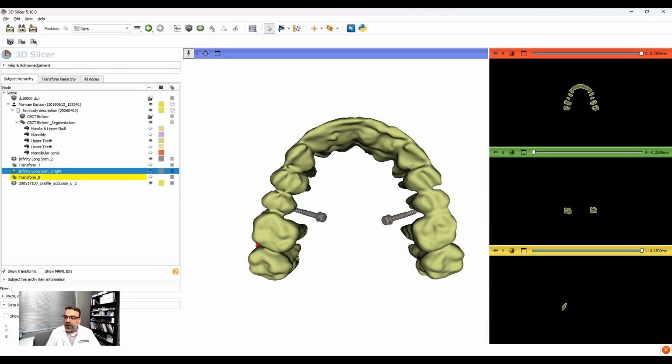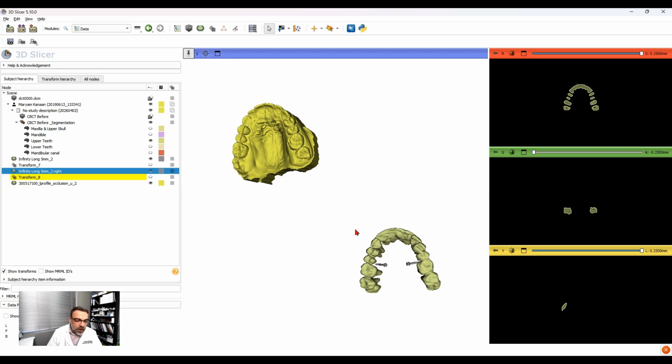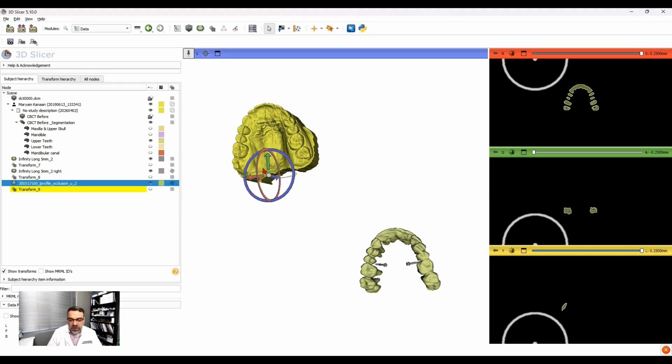Okay, where is the file? Again, it's somewhere. Click here. It's right there. We have to move it from here to there. Same thing. So this is my file. Okay, and what we will do, we'll create a transform. Let me see the interaction. Now center it. Okay, now it's centered.